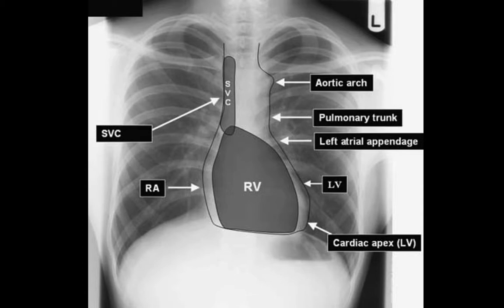There are some other factors by which we can say which chamber of the heart is enlarged. I will describe it later. And now you see, this is a quite common picture, usually available in almost all books. This is the aortic arch. This is the pulmonary trunk. The left atrial appendage is not so important, just forget it and remember that there is a concavity, and the superior vena cava is usually superimposed along this line. You cannot commonly detect the superior vena cava.